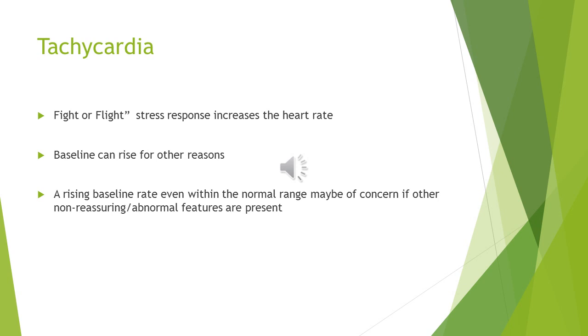That's why I'm saying you don't interpret CTG based on a snapshot. Don't take just the segments which the midwife is concerned about. You have to look at the previous segment. What was the CTG like? Is the baseline rising? Is it dropping? You have to make a correlation between the start of the CTG and what's happening now.